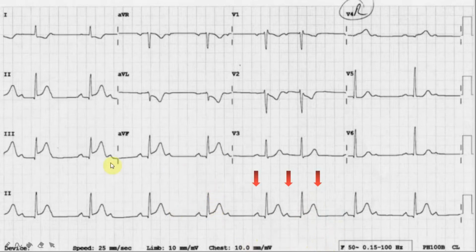If we look at only this particular area, it is going to be very difficult to differentiate between Mobitz type 1 and Mobitz type 2. But if we look at this area, that gives us a very concrete idea that there is a progressively prolonged PR interval. This PR interval is quite prolonged from the usual PR interval. So this is a progressive prolongation of the PR interval followed by a non-conducted P wave. This is Mobitz type 1, or Wenckebach's block.